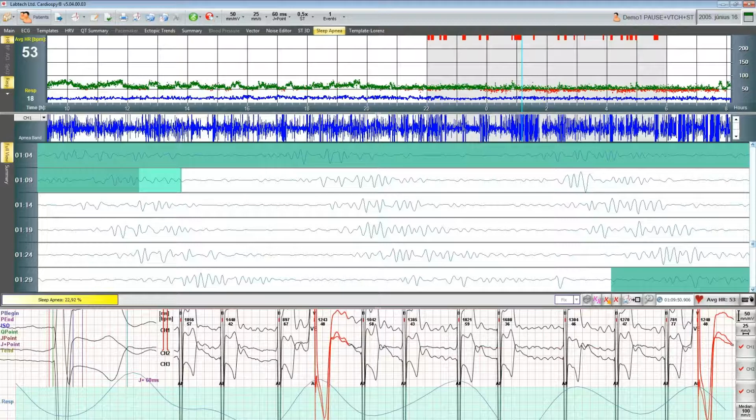Now that we are in the analyzing surface and we have a result for every recording, I think it would be best to start with the printing. As I said, here's the toolbar where you can find the print functions and also the exporting the result functions. It's almost the same, but with the print you can actually print on a printer, but with export you can export the results in different formats like PDF or in Excel formats and so on. So let's click on the print.